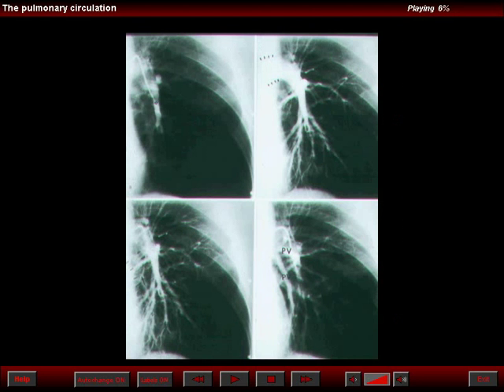A close-up of the left lung shows the typical findings of emphysema, the compression of intrapulmonary arteries, the absence of pulmonary vessels, the distortion of the pulmonary vasculature in the medial aspect of the left base. They appear compressed. There is separation of arteries in the lower third of the left lung, and there were no filling defects that could be seen within the pulmonary arteries.